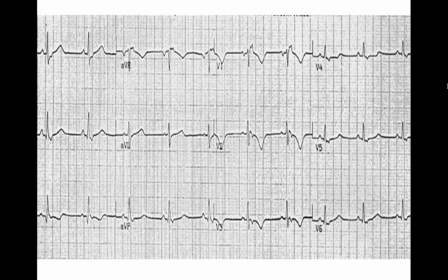In this next 12 lead, this next patient, again looking at V1, we definitely see an extra little fluctuation in that ST segment. That's where the electrical impulse is hitting that fatty deposit, just fluctuating a little bit, rippling a little bit, and then catching the muscle tissue on the other side and continuing on through. And then we have those inverted T waves.